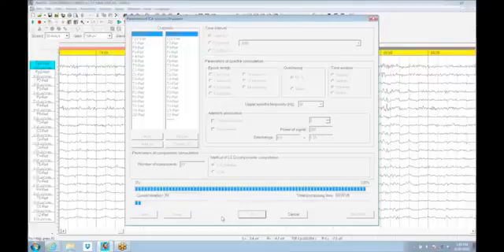And this takes time. This is a computationally intensive chunk of mathematics, but it's running the Infomax ICA algorithm through the EEG, hundreds and hundreds of iterations to learn this 100-second chunk of the EEG. And once it's completed its learning of the spatially distinct generator patterns, we'll be able to look at them as components that make up this EEG.